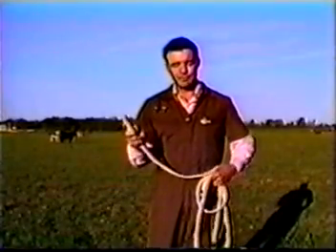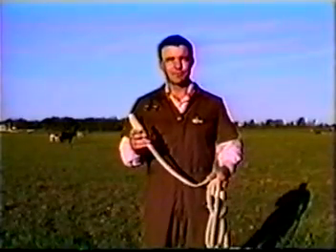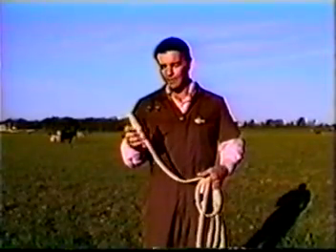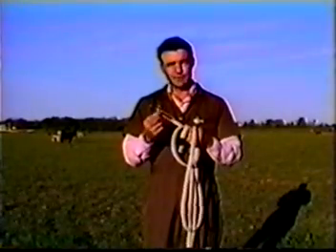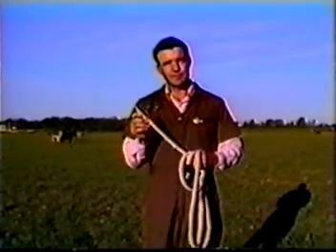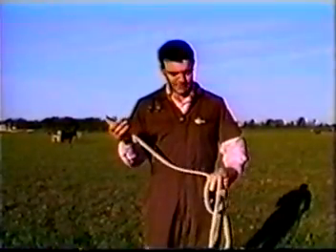One of the most important things that we will discuss here as far as using the ultrasound is how to handle the transducer. The transducer tip is very sensitive to any type of bump or drop. Along the sound producing ridge, there are pixels and crystals that can be broken and damage the resulting resolution of the unit. So you want to be very careful in handling this.